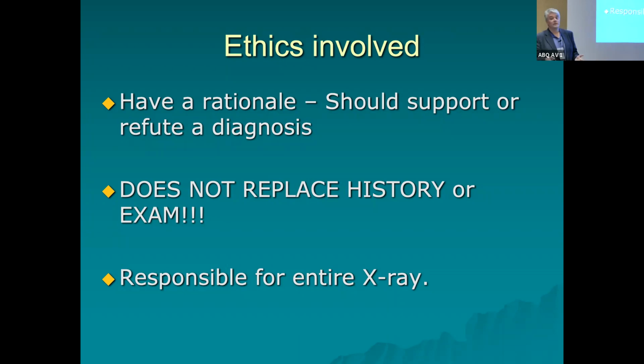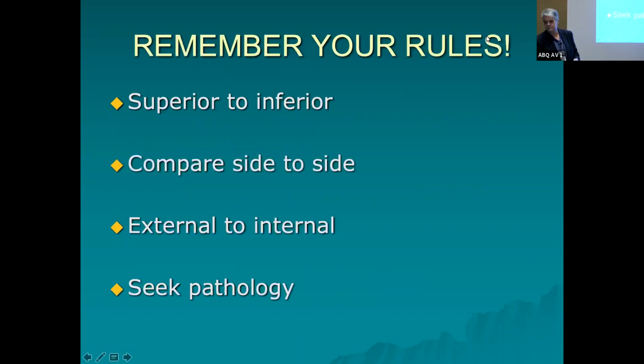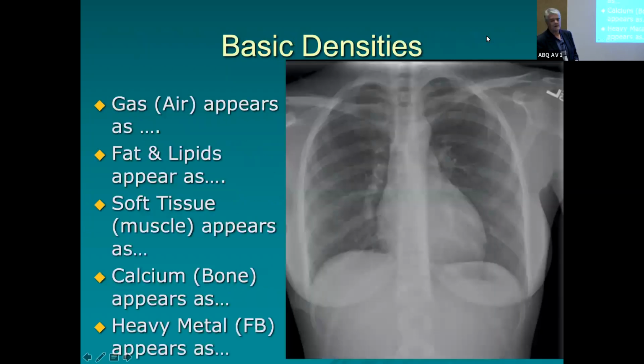You are responsible for the entire x-ray when you get an x-ray. I say that because I had someone last time who ordered an x-ray such as this right here. This is when they had the view box, and he was looking for some type of pneumonia right here. And as he put that x-ray up in the view box, it covered up right here.